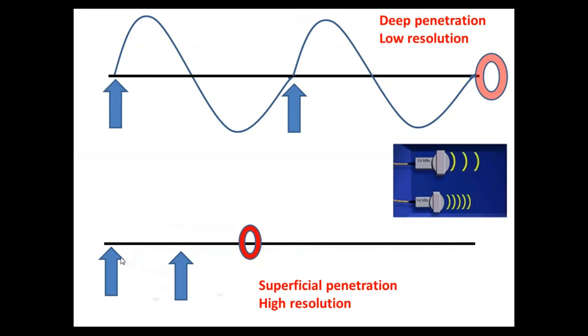High frequency can give you good resolution, and also it is good for superficial structures. So in neonates, we are relying more on high frequency ultrasound probes.